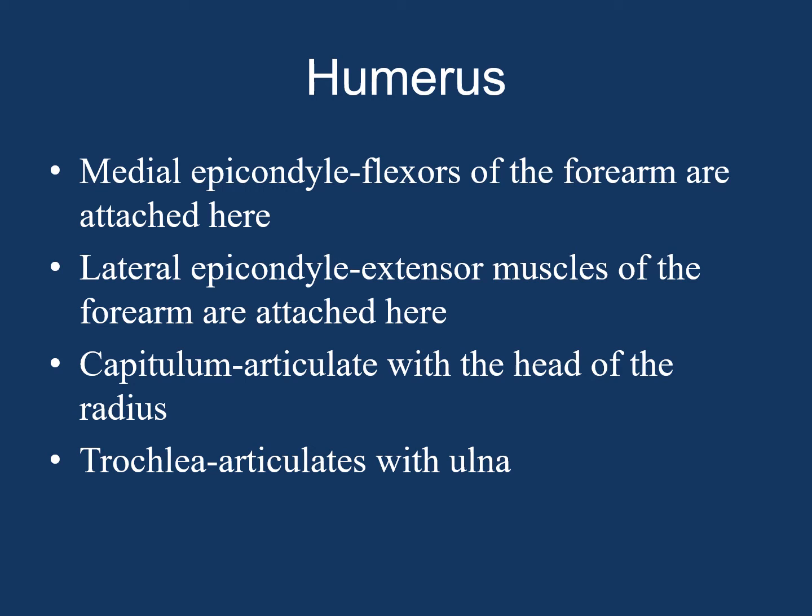You may be wondering why I am describing the anatomy of the different bones. Because when you read in our report, you will know when we say there's fracture involving the capitulum or the trochlea, at least you will know where to look for it.